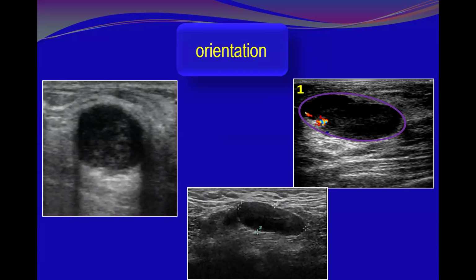Give me the orientations for this one, and this one. The one at the left, round it. This is not parallel.